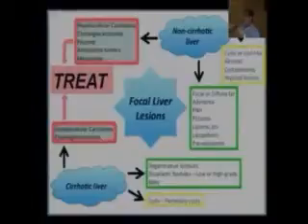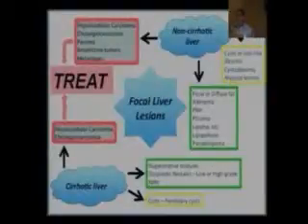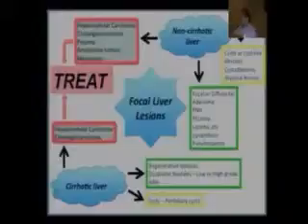And the important thing to take home from here is that you first look at whether the liver parenchyma is normal or you have an abnormal liver background parenchyma, and based on that you characterize your spectrum of lesions. I've not put the entire gamut. I'm not going to talk on metastasis at this point of time. I'm not going to talk on cholangiocarcinoma. That's for the second half of the lecture.